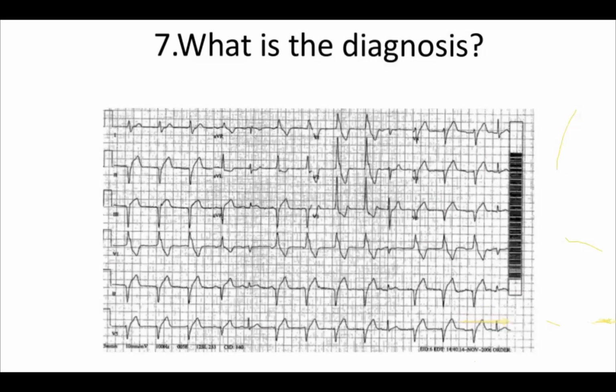Now, when you see something like this, which is abnormal, you see the QRS complex is wide, isn't it? And the other thing is, if you see the rhythm strip, and even the aVR lead, the axis is totally changed, right? And you can't see particular P waves. So actually, this is a rhythm which is arising from the ventricle. But it is not fast enough to say VT, ventricular tachycardia.